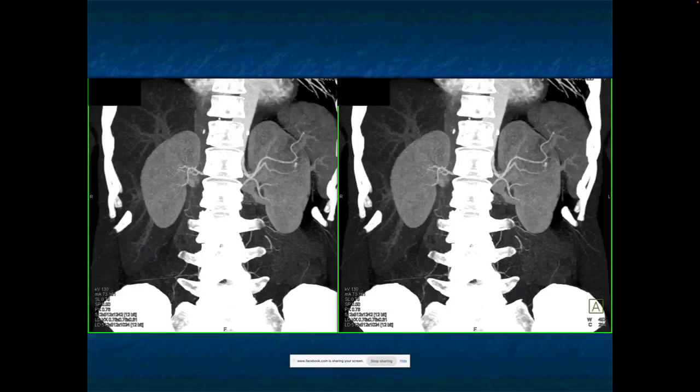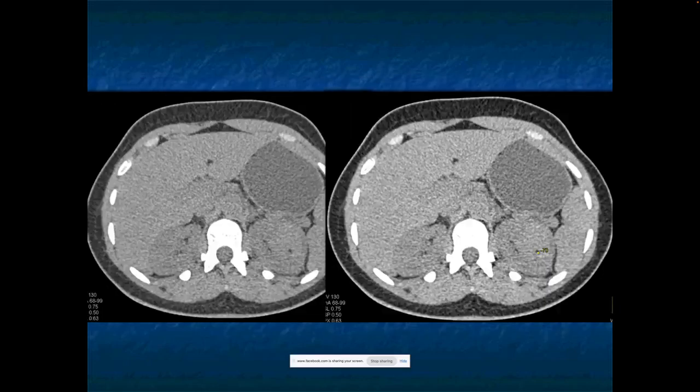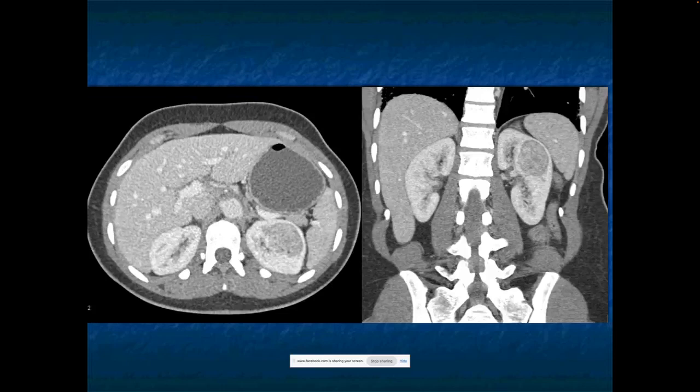This is a vascular lesion which has an area of fat within it. Here you can see a little bit, maybe a tiny AV shunt within the lesion. And then here it is in the non-contrast. That little low-density zone measures minus 70. And what should I be thinking about? Yes, your solid mass looks like a renal cell, but with a little dot of fat, you've got to say to yourself, could this be a lipid-poor angiomyolipoma that only has a small amount of fat present? That's what you've got to think about.